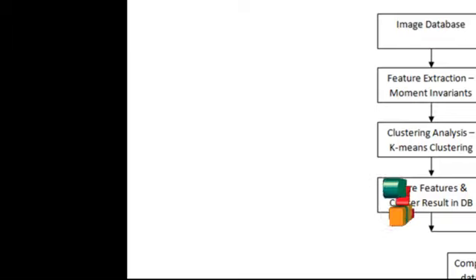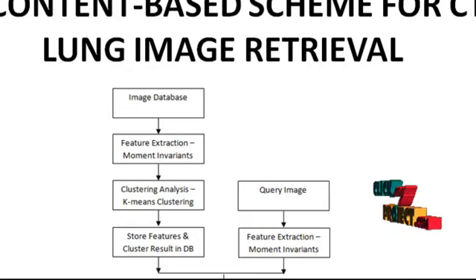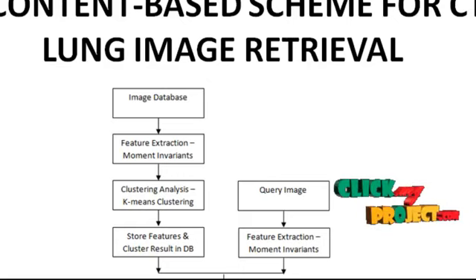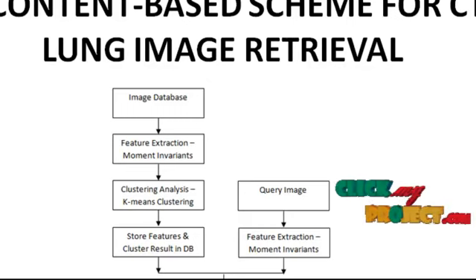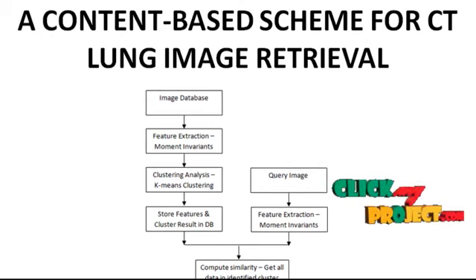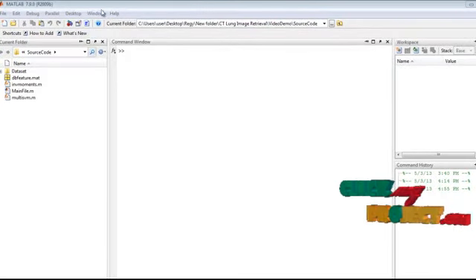Once we have determined the cluster similarity matrix, we attempt to merge progressively clusters from the same relevance class using a minimum distance criterion. This process is repeated until the number of remaining clusters become relevant to the image categories in the retrieved window, and the system will output a set of candidate images that are similar to the query image. Now we'll see the demo of this project.